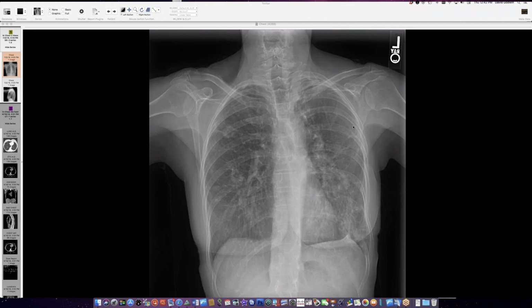All right, this woman has a long history of Mycobacterium avium infection. Actually, it was Mycobacterium, hers was speciated to intracellulare. And so she's got this patchy lung consolidation. This is an original lesion which she's had since the 90s, when they first detected this organism.